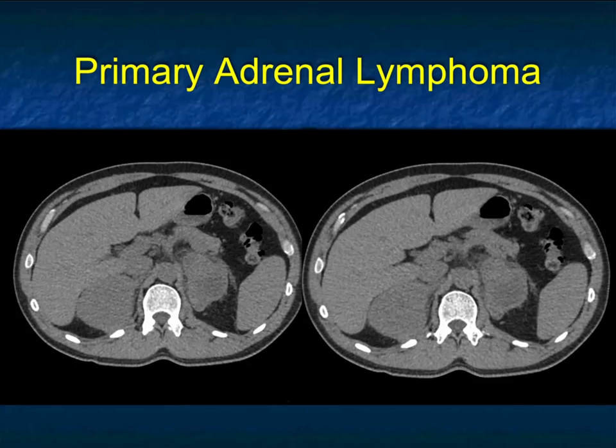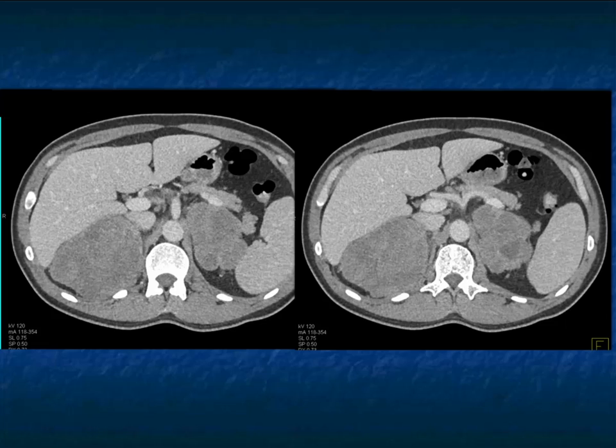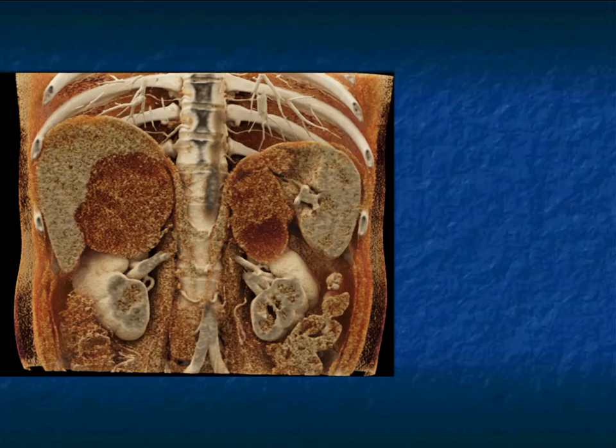Now, in contrast, bilateral adrenal masses, you go through the differential of metastasis, bilateral pheos, adenomas, metastasis. Arterial phase, it shows impressively that it's not vascular at all. There's some enhancement bilaterally, but not very vascular. And when you go from arterial to venous, the areas of low density, maybe representing necrosis, are better seen, particularly on the coronal view, on the excretory phase image on your right.